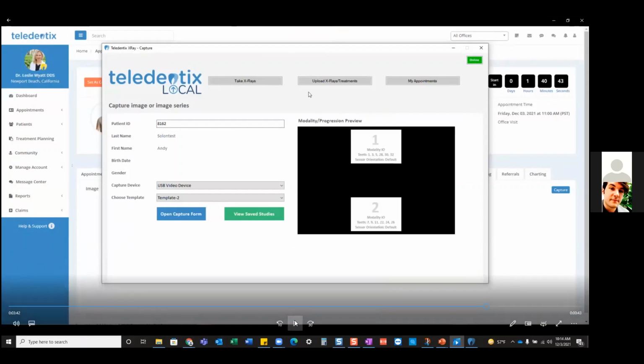I never lost internet. Go into your next patient, start it up and do all that good stuff. What I'm going to show you here is once I'm back online, you can do this at the end of the day. You can do this in the middle of your day as soon as you're back online. I'm going to upload my x-rays, my treatments, my progress notes, everything that I did offline. I want to make sure that is saved. I want to lock that in. I'm going to make sure I don't lose anything.